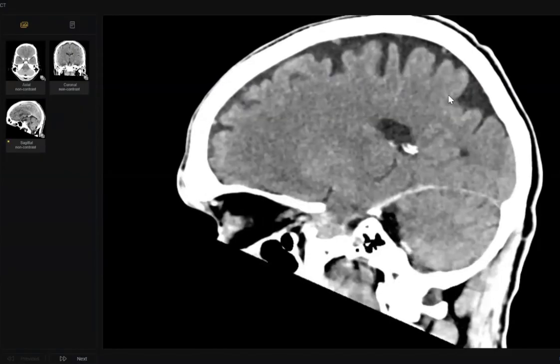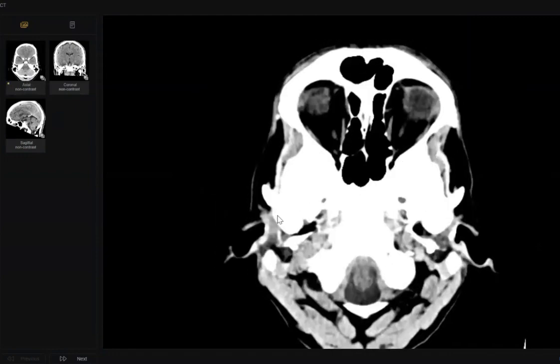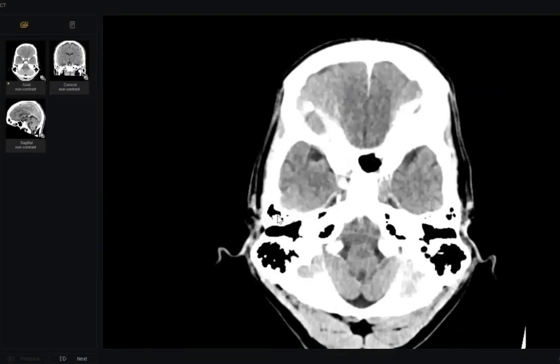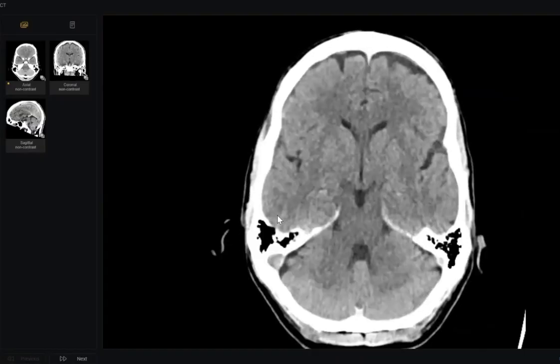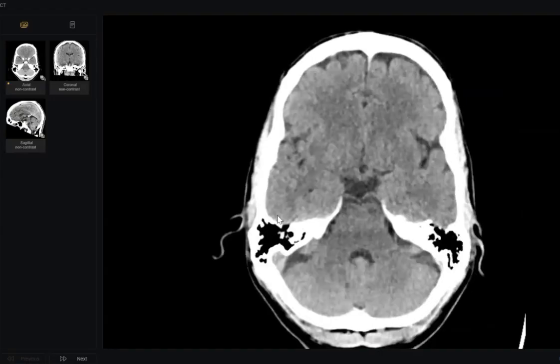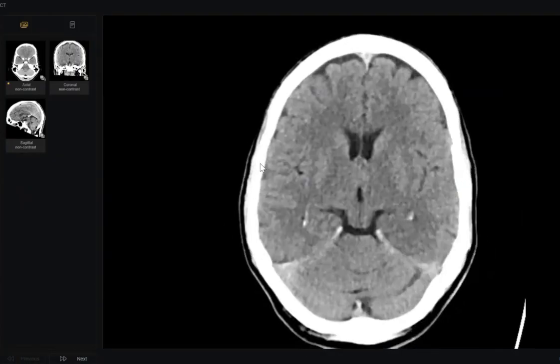Could you have another look, please? He's an old patient and has very deep coma. Okay. What is your review areas? You didn't tell me about many so important things. I think the basilar artery is appearing hyperdense. Okay. So I'm thinking of a basilar artery thrombosis, which is causing an infarct in the posterior circulation. What will you do next? So I would want to confirm this with a CT angiogram or an MRI angiogram.